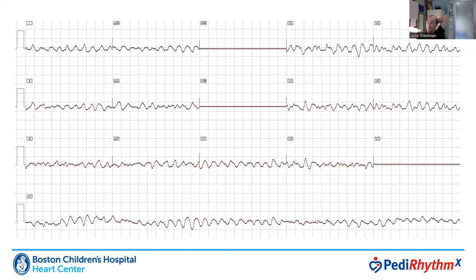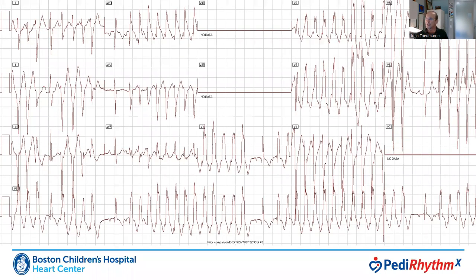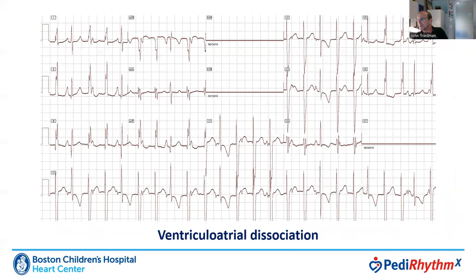This is the most myopathic ventricular arrhythmia you'll see, and you really don't have to worry about this patient, because when you see a 12-lead electrocardiogram of ventricular fibrillation like this, you know that the patient already has a Berlin heart or some other form of VAD implanted, and that their rhythm doesn't matter much anymore. It matters a lot more when you see a patient like this who's having paroxysms of scary, wide complex tachycardia. It's important to be able to distinguish those tachycardias from SVTs with aberration.